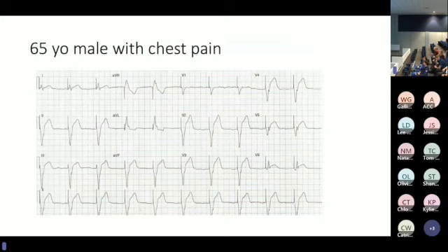Give a bit of time to have a look. Okay, hands up if we're activating cath lab. Hands up if we're not. Okay, so what we're looking at, does anyone want to have a go at what we're looking at?